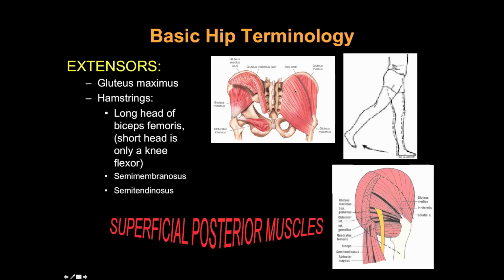So the gluteus maximus will attach posteriorly and medially to the iliac crest, as well as portions of the sacrum and coccyx, and then insert into the posterior margin of the proximal femur. And here's the close relationship between the piriformis with the sciatic nerve traveling anteriorly, and then the superior gemellus, the obturator internus, and inferior gemellus, and the sciatic nerve traveling from anterior to posterior and from proximal to distal between the piriformis and the superior gemellus. And then more inferiorly, we see the quadratus femoris.